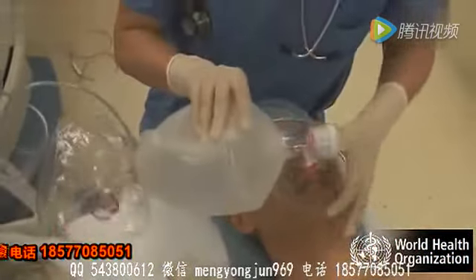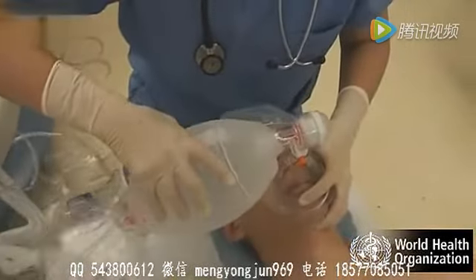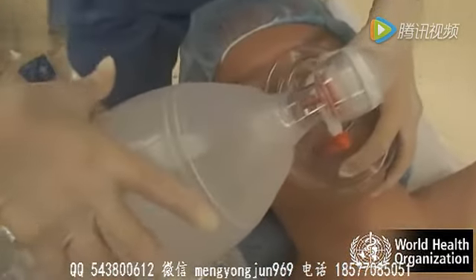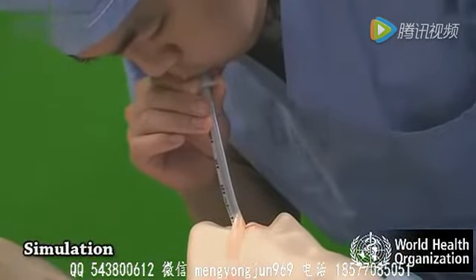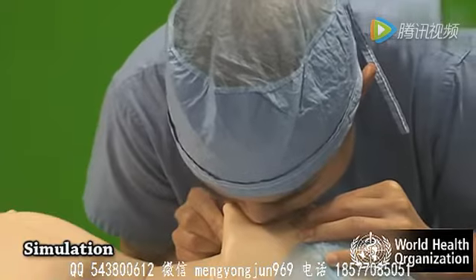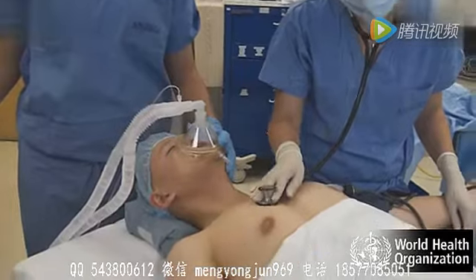If it is felt that the anesthesia equipment is faulty, use a self-inflating bag to ventilate the patient with air while new equipment or oxygen supplies are obtained. If equipment is missing, mouth-to-tracheal tube or mouth-to-mouth ventilation may be life-saving. It is important to treat each element of the sequence in order.